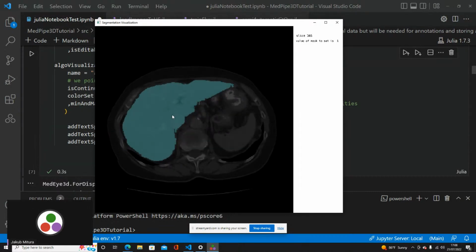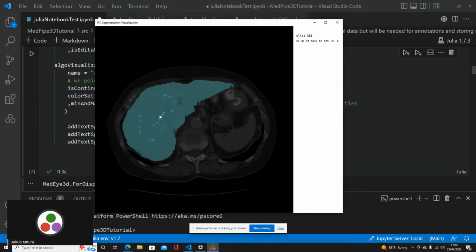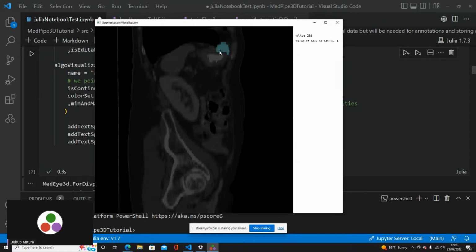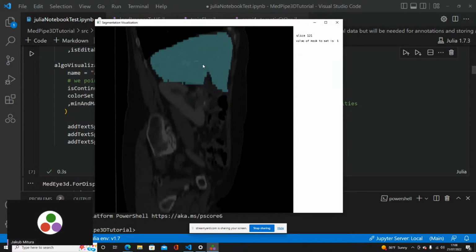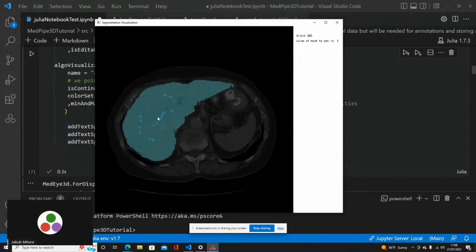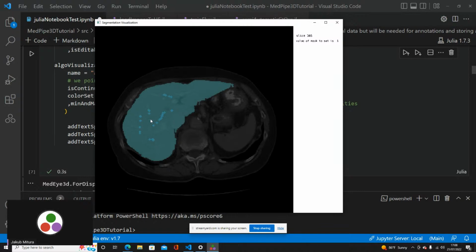With the annotations, this is relatively simple. You just click and drag, and you'll see the interaction. You can see it's saved. It can be seen also on other images, like here. So this is how the annotations work.